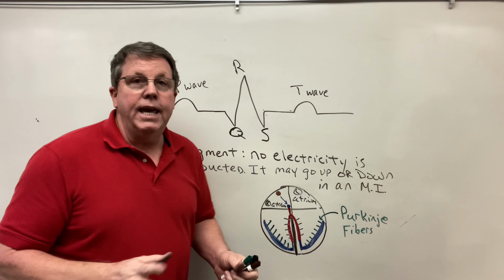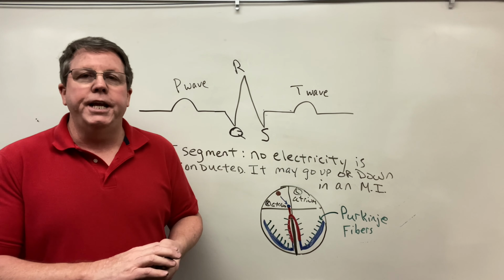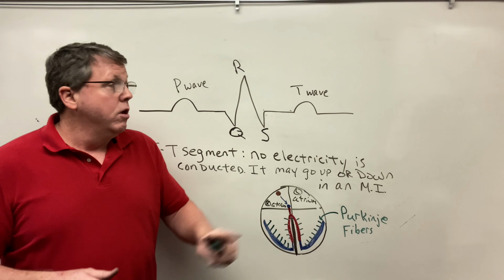That is basically it for how to read an EKG. This is a very general explanation of it. For anyone who's in the medical field, this is actually a semester course, if I understand correctly, learning how to read these. One last thing.